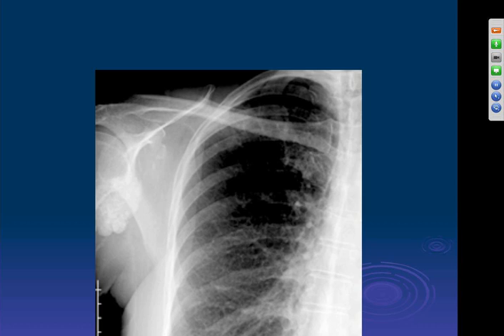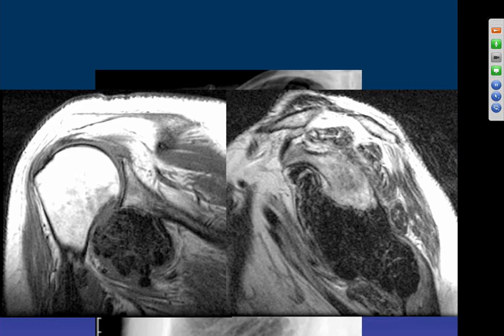Okay, Eric. This is a radiograph of the chest showing some opacification in the axillary region, a somewhat rounded, multilobular, possibly calcific mass, and then the MR shows very low signal intensity, so it does suggest calcifications. This looks pretty coarse. Maybe some could be sequelae of hemorrhage.